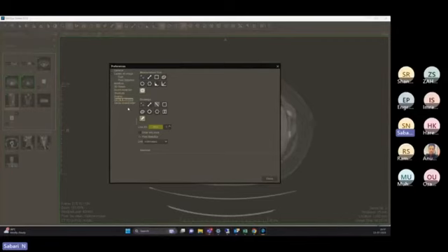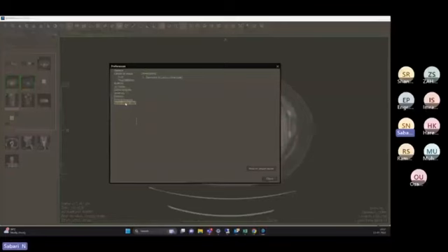So this is the kind of settings, the drawing tools and all. The colors I showed, the ruler, rectangle, polygon and all those measurement tools are available here also. And in display, you choose what you want displayed on the screen, like the patient name: whether you want to display it or anonymize it.